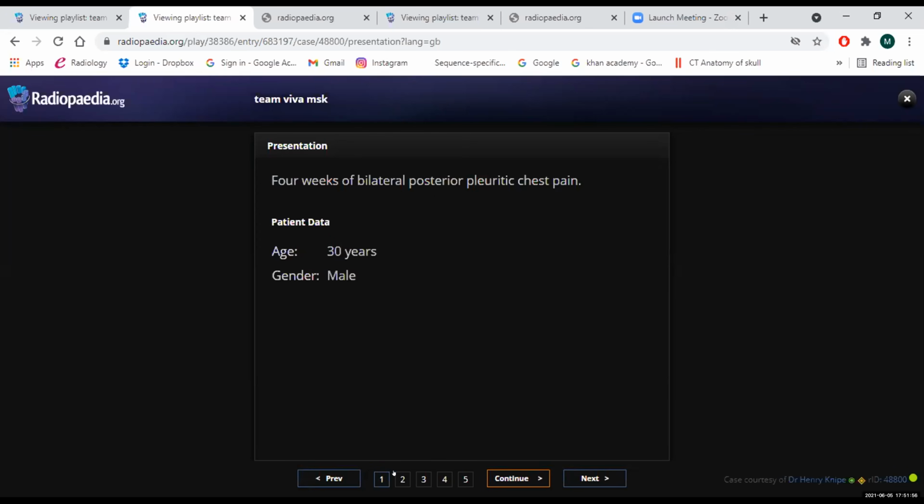And in this case, it was pretty hard to detect the lesion on the chest X-ray, but ultimately you picked it, and on CT scan you were fine, and the differentials are metastasis, multiple myeloma, and tuberculosis. But this was diagnosed as tuberculosis.